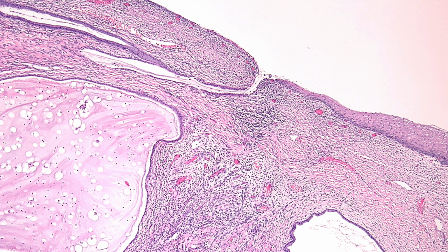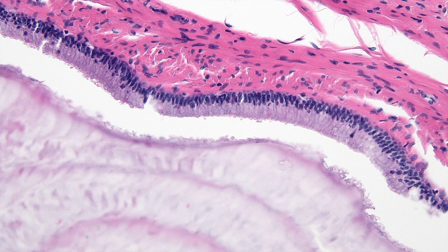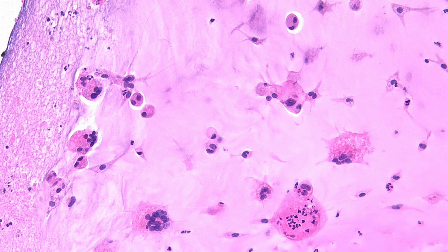These are frequently encountered at the cervical transformation zone and are large fluid-filled spaces lined by endocervical epithelium. The lining cells show normal-appearing endocervical epithelium, and frequently the cystic contents of the Nabothian cyst can contain multinucleated giant cells and inflammatory cells. Another important thing to note on histologic section, so when these cells show up on pap smear, you know what you're looking at.